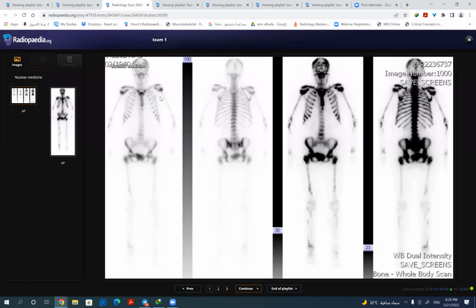Okay, yes. So I am presenting the bone scan images of a patient. I'm just going through the images for a while. Okay, the striking abnormality I can see is that there is no uptake within the kidneys, and this is suggestive of a super scan, I believe. And there is diffuse uptake within the skeleton, and no differential uptake within the soft tissues is noted.